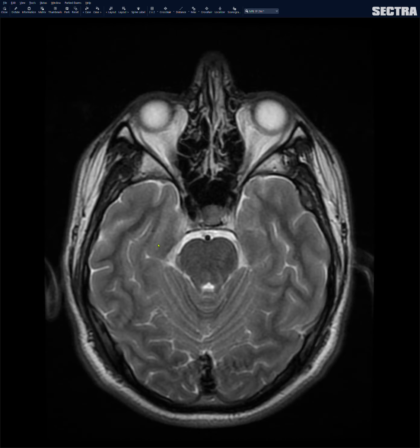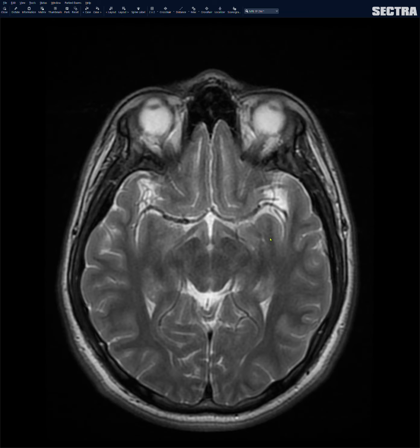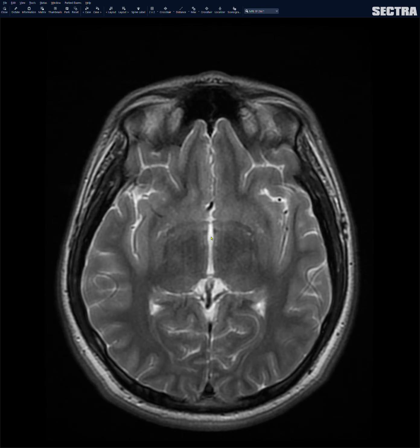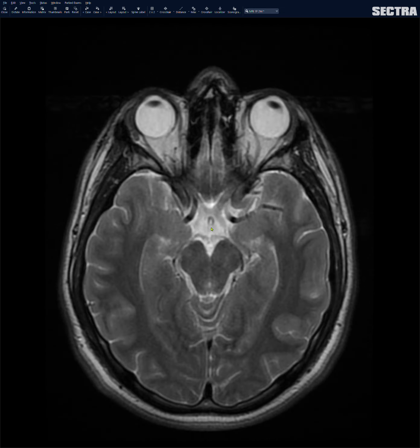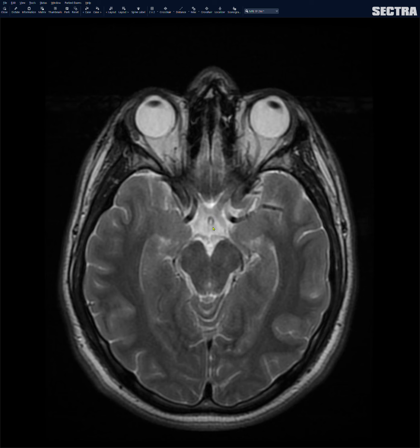I look at the temporal horns of the lateral ventricles, make sure they're not dilated, which can be seen in the setting of hydrocephalus. I look at the frontal horns, okay, and then I look at the third ventricle over here. And then after that, I look at the suprasellar cistern. Okay, make sure that you have CSF there. CSF can be effaced when there's severe cerebral edema or a mass.